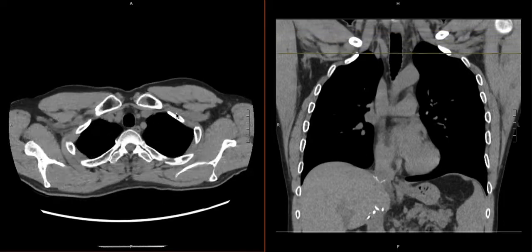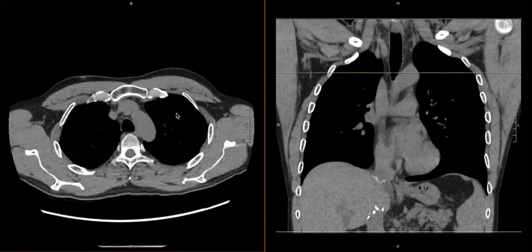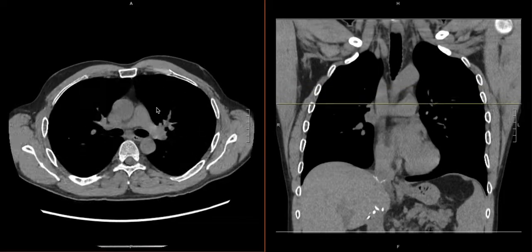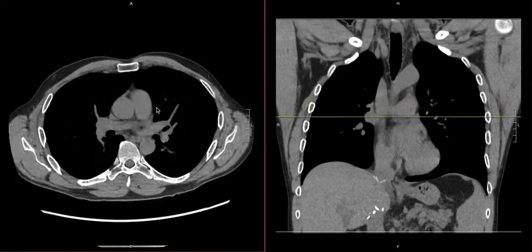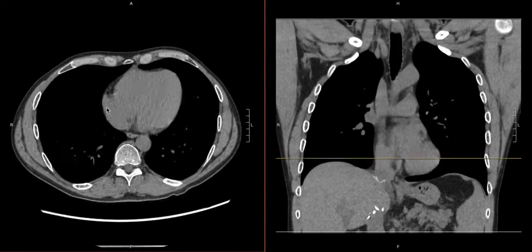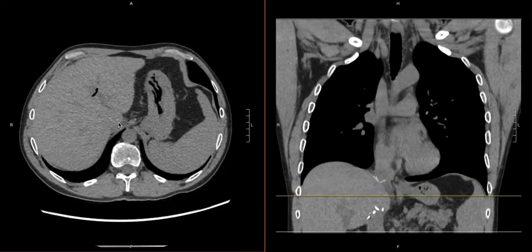Again, it can be kind of hard to trace, but you can see those jugular veins coming back into the great venous vessels and plugging into the SVC. So that can be helpful to just appreciate, again, the extent and how much you trace these vessels may depend on the context. Oftentimes it's not really a focal point, but just to appreciate that you can look at the veins. And then similarly, if you go down into the abdomen, you can see the IVC.